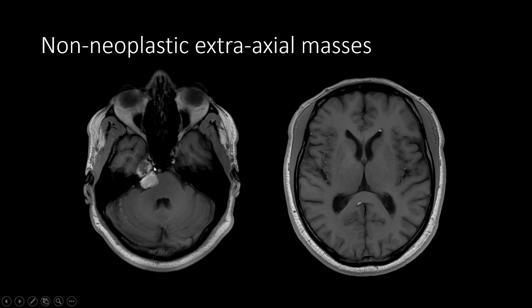This is an example of a dermoid cyst that ruptured. So this is a T1 weighted sequence showing a high signal extraaxial mass in the prepontine cistern and right Meckel's cave. And you'll notice that there are small speckled foci of T1 shortening overlying the cerebellar hemispheres, within the sylvian fissures, and actually also intraventricularly. And interestingly, it lies in the non-dependent portion of the left lateral ventricle, consistent with a lipid droplet. And this is consistent with a ruptured dermoid cyst.